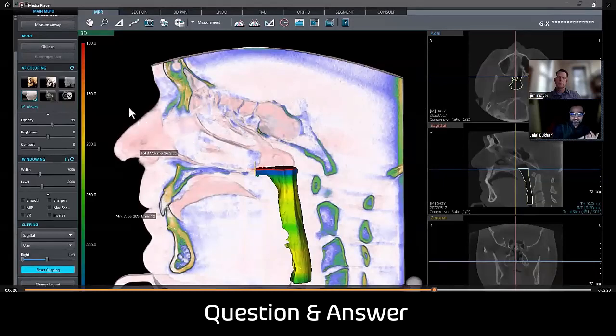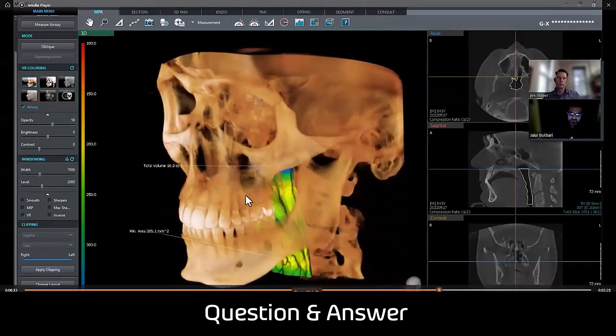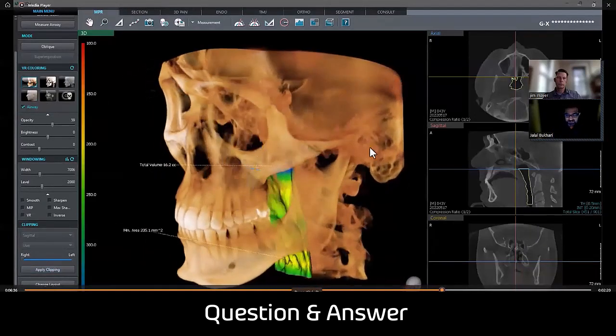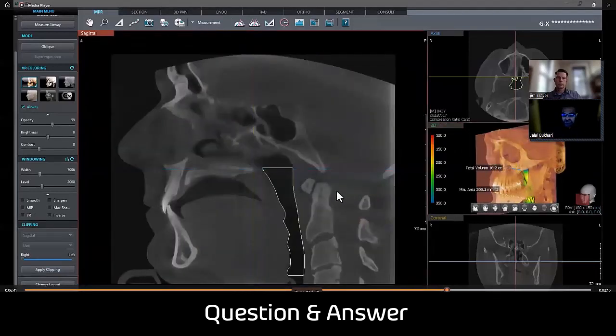And through specific algorithms and things that we can use on the toolbar, we've highlighted the airway areas and other areas, so that you have a good idea of what the volume looks like, what the soft tissue area of the airway looks like, or what the airway looks like, specifically posterior to the soft tissue structures. Again, this is done specifically through the clipping capabilities. And you get to know these things once you actually work around with the different softwares.